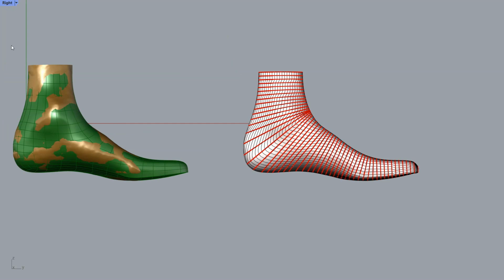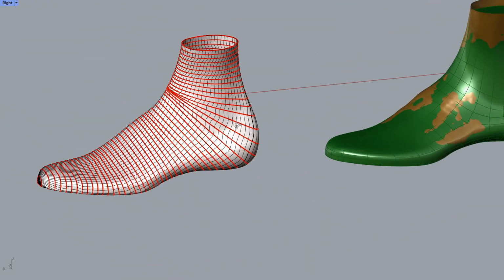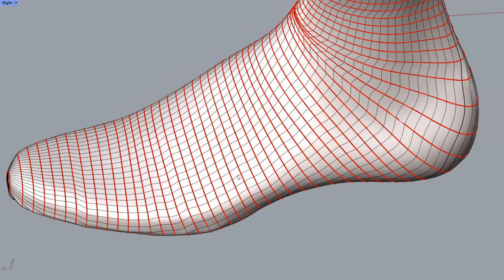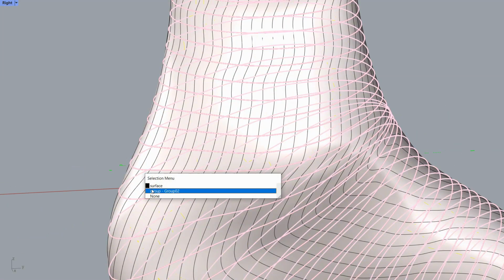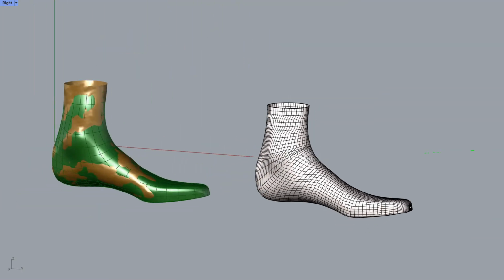Another layout you often see to make orthopedic lasts is like this one with the red curves. It's made by projecting curves on a cast and then lofting a surface through the curves. But what you end up with, I'll delete the curves, is a surface like this.